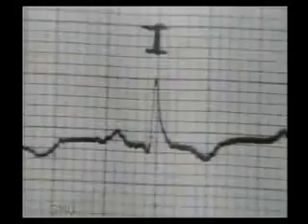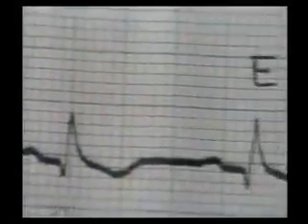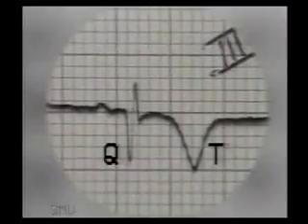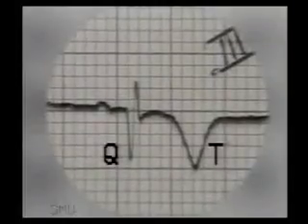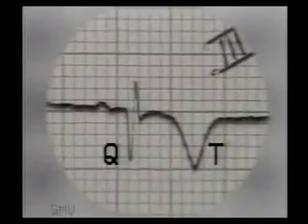Now see another tracing. No Q wave in inspiration marked I, and note the appearance of Q wave during expiration. Lead 3 of this ECG shows deep Q wave, isoelectric ST segment and deeply inverted symmetrical arrowhead-like T wave of inferior wall myocardial infarction. This picture is seen between 3 weeks to 3 months. If ST segment elevation persists after 6 months, it suggests a development of ventricular aneurysm.